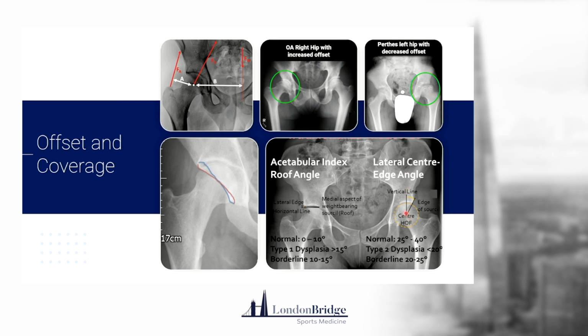We often look at coverage as well. So particularly for your younger, fitter patients in their 20s and 30s and even 40s, sometimes you're querying, okay, is this a sign of hip dysplasia, or do they have an over coverage, or is there some element of hip impingement? I think an X-ray is not the definitive way of looking at that, but it's a very useful way of looking at that. So we call this the crossover sign. So here you can see the red line marks out the anterior aspect of the acetabular rim, and the blue line is the posterior. And what happens if the anterior one crosses over the posterior, you get this figure of 8 sign, which basically means there's a bit of anterior over coverage.